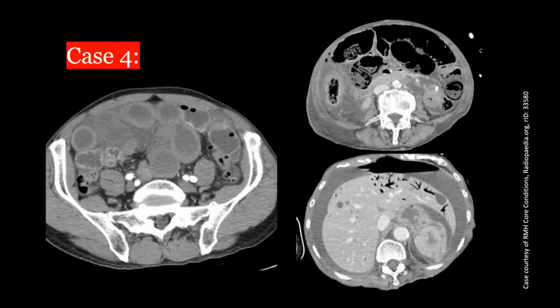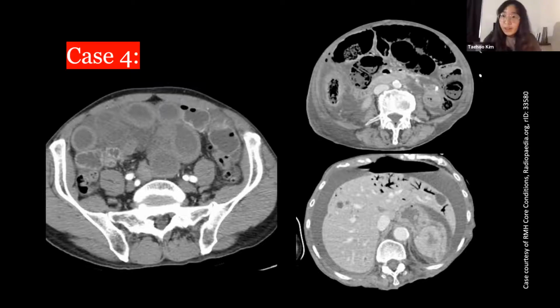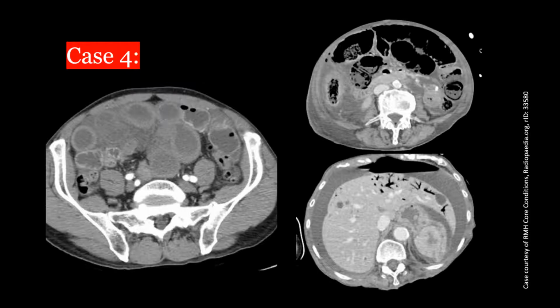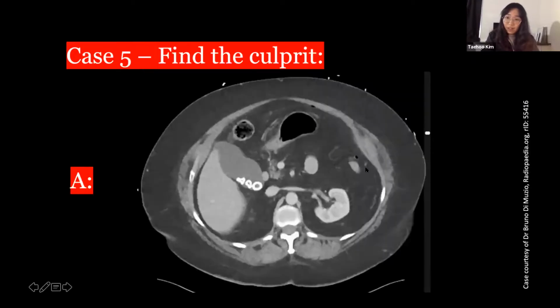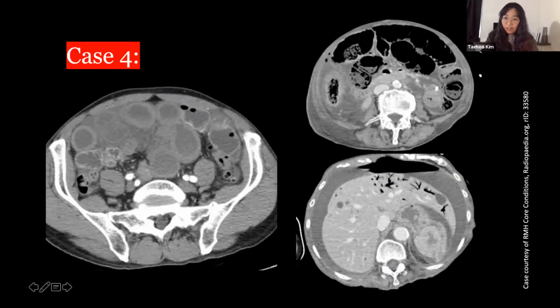Ischemic bowel with compression. Could you repeat that? Sorry, Mostafa? Ischemic bowel with probable compression. Yes, exactly. So this was a case of small bowel obstruction with bowel ischemia. So the bowel loops are dilated, and this was detected too late. So this patient developed pneumatosis intestinalis, all these air lucencies in the bowel walls, as well as portal venous gas. So all this gas is tracking up to the liver and causing some air in the liver itself.